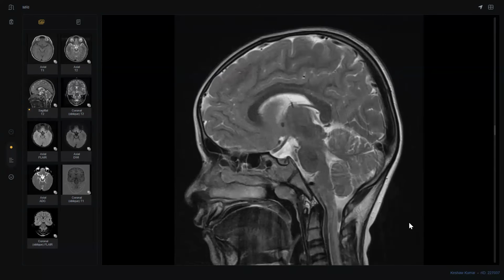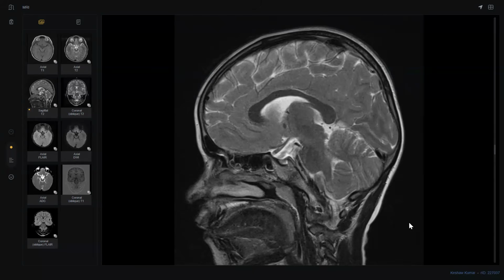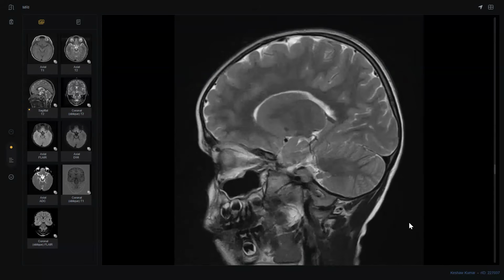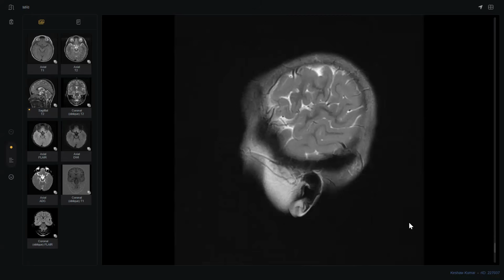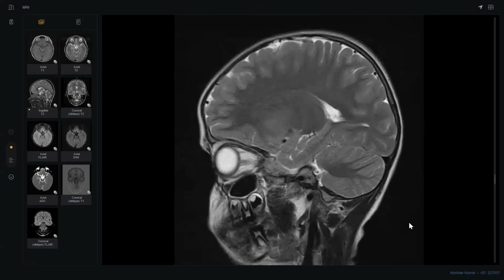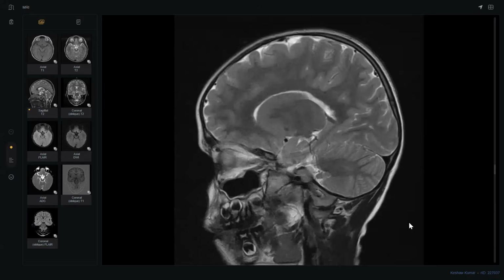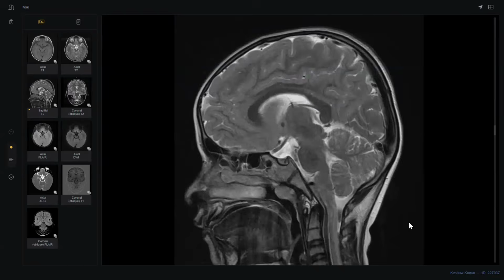So do you remember the history? 10-year-old patient with seizures, sir. When you are presented with a young patient with seizures, what are you searching for? What is your concern? Sir, I would also like to rule out mesial temporal sclerosis in a young child by looking at the hippocampus. Before going to the hippocampus, show me this region that you are describing in sagittal.